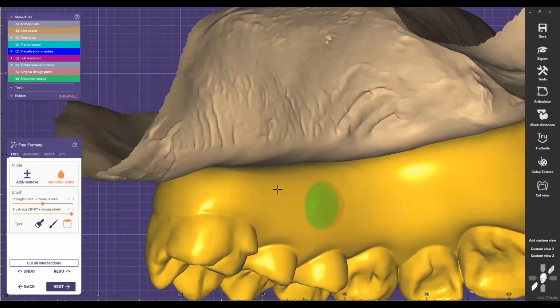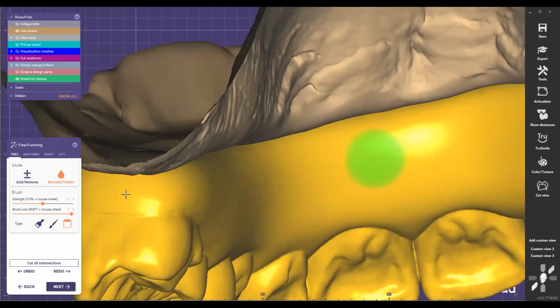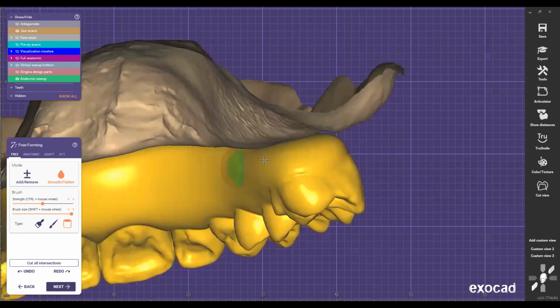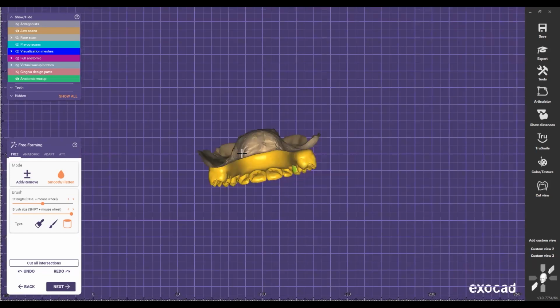When I come on the lingual, I want to make sure it looks nice and smooth and flat. So something here, and then see this bump area. I just try to get rid of those areas, and here too. So I see it from different angles, and I'm like, okay, looks beautiful there. I'm just gonna wait now for this one.